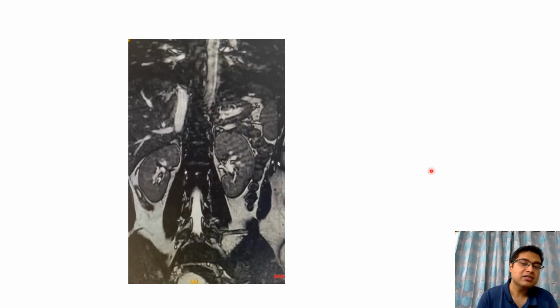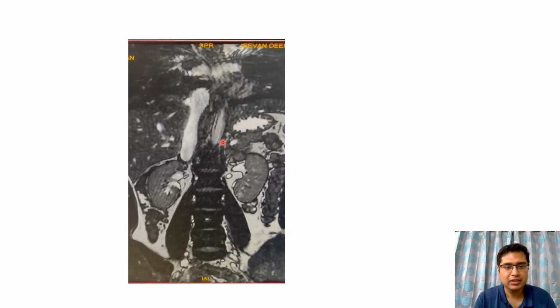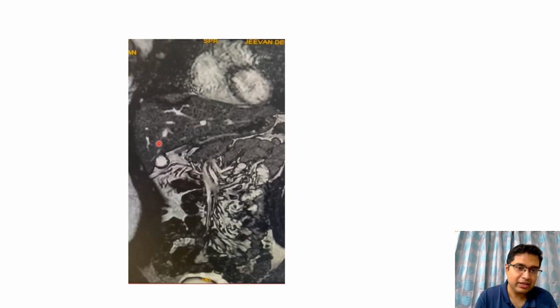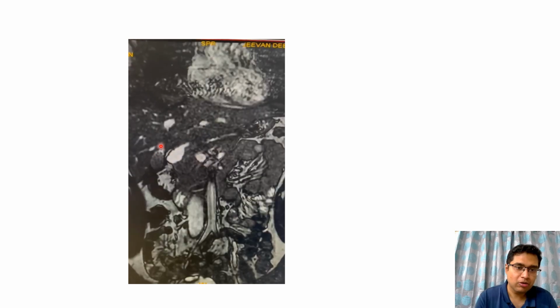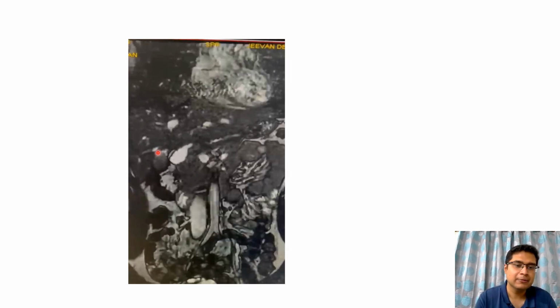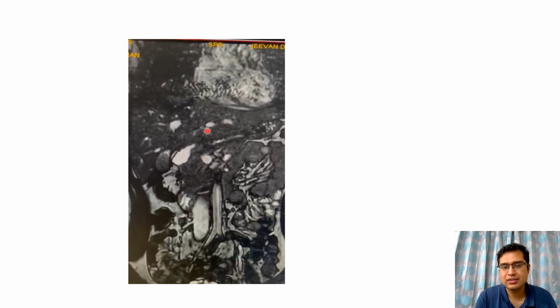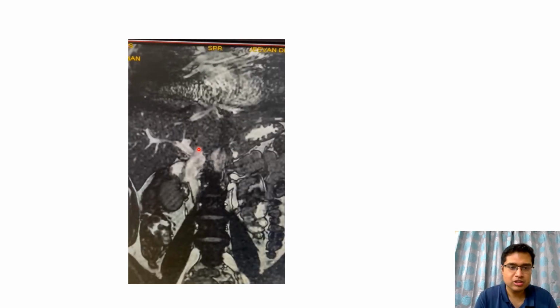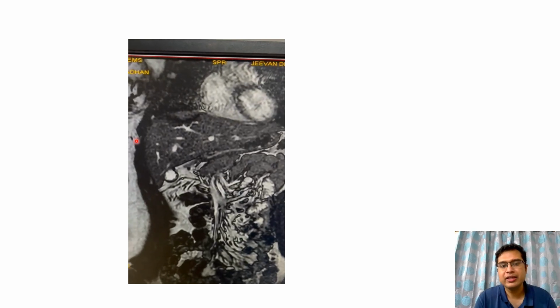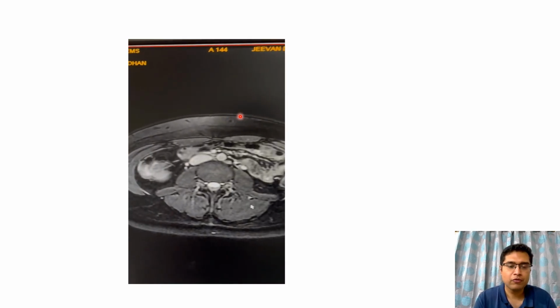So finally, an MRCP was done for this patient, and this is the MRCP of this patient, and it was done after a lot of effort, that is taking very thin sections through the abdomen. Multiple tiny T2 intermediate filling defects in the GB lumen as well as the cystic duct, along with sludge, were seen. The CBD and the IHBR were all of normal diameter.